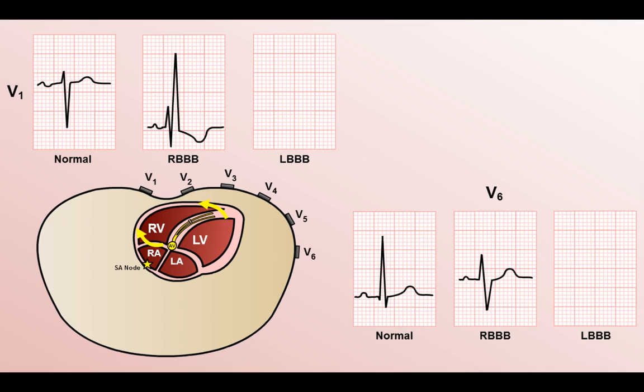Presence of a right bundle branch block is usually most quickly suggested by the overall appearance of the QRS complex in V1, which is sometimes described as M-shaped. Occasionally, trainees will be taught to look for the "bunny ears," referring to the two separate R waves. I've found that using the bunny ears reference actually leads to greater confusion, as a similar pattern of prominent notching can occur in other leads without clinical significance, but which are frequently misinterpreted to be indicative of a major conduction block.